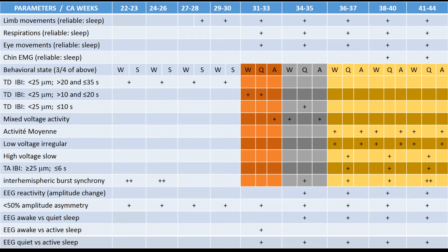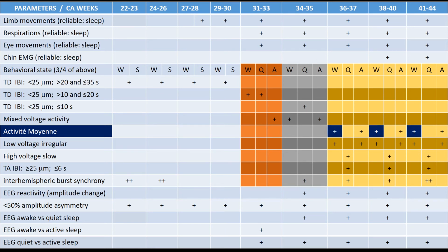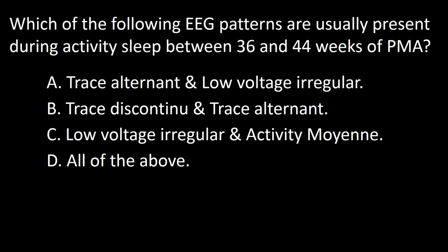This chart, as you can see, represents activité moyenne, which occurs during awake and during active sleep from 36 to 44 weeks. So the answer to this question is C.